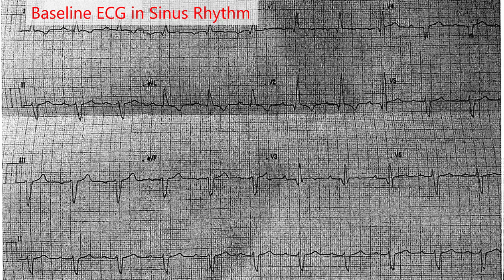So in this person's case, we were able to dig up a 12-lead ECG. This is not the greatest reproduction, but you know how it is. You get what you get in these cases. And this is the best we can get from an outside hospital of this patient in sinus rhythm. So looking at the rhythm strip, you see that it's clearly sinus rhythm. The person has a long PR interval, so evidence of clear first degree AV nodal block.